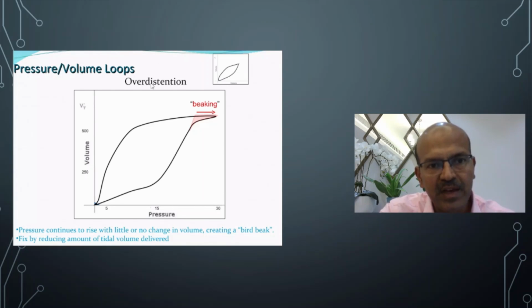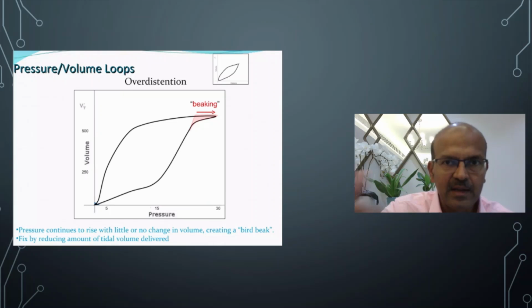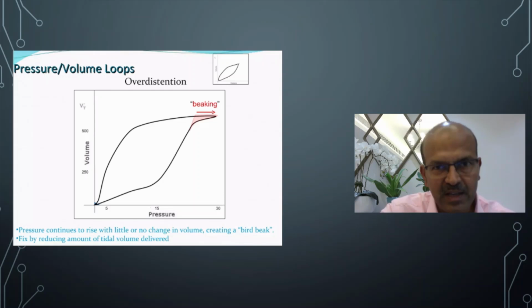Remember that we have something called iatrogenic persistent pulmonary hypertension. If you're over distending the lung in the first 3-4 days, you're compressing the pulmonary veins, your pulmonary pressure increases, and you're causing pulmonary hypertension. So the baby may behave as if they have PPHN, while actually you are creating the problem by giving more pressure. This happens if you don't wean the pressure appropriately post surfactant. So it's very important to monitor these aspects. And volume guarantee, of course, is a very big bonus in these situations; even if you are not changing it, if you keep the tidal volume appropriate, it will likely improve.